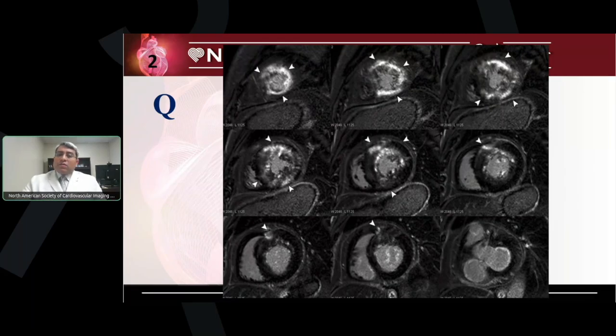This is not the commonest enhancement we see with hypertrophic cardiomyopathy. The commonest one is enhancement at the attachment of the right ventricle into the interventricular septum. But as you exactly mentioned, the degree of enhancement correlates with the prognosis of sudden cardiac death or arrhythmias.